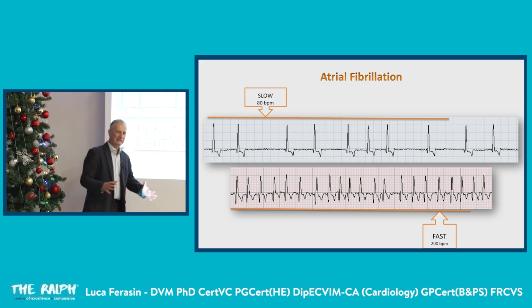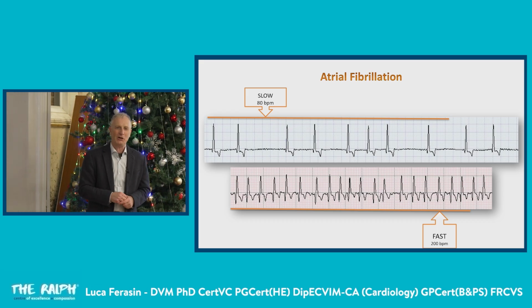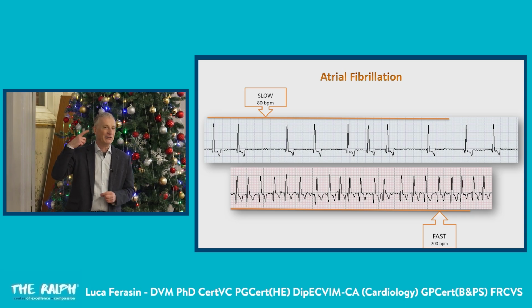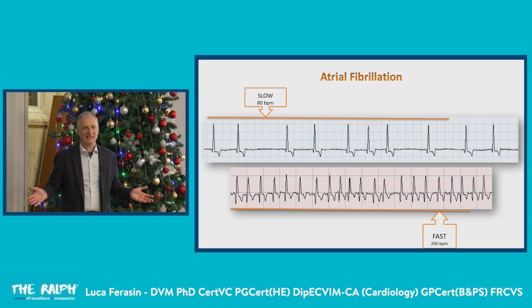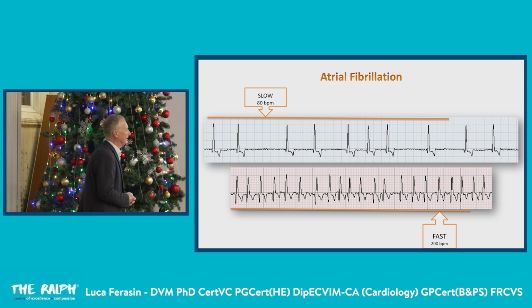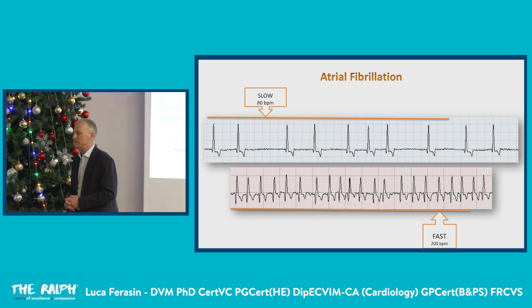Right, now I feel a little bit less comfortable in diagnosing atrial fibrillation because I don't see the fibrillatory pattern on the baseline. So I've got the mantra from my mentor that taught me that if it's fast, if it's narrow, if it's irregular, it's atrial fibrillation until proven otherwise. There are no other tachycardias that can be so irregular like atrial fibrillation. And that works 99% of the times. And so if you see something like this, you got your diagnosis of atrial fibrillation.